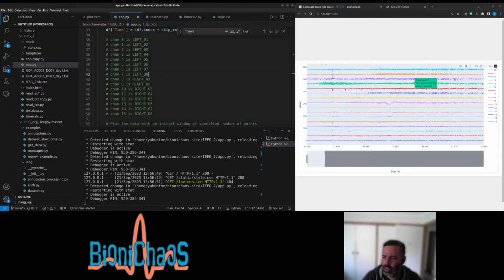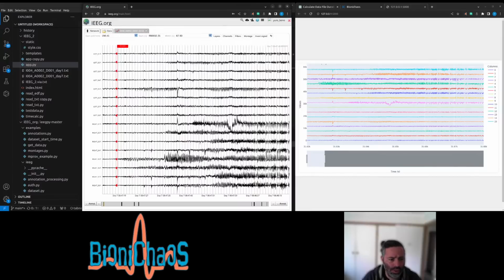And onset is on 02, which is left 03. Let me check. Yeah, onset is more like left of 5 or even. Okay, now I'm having doubts.